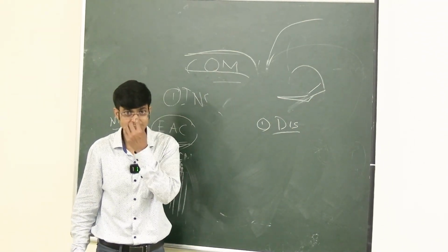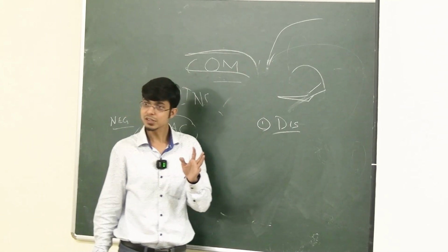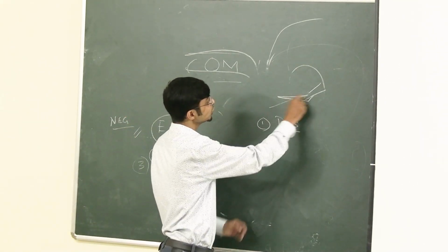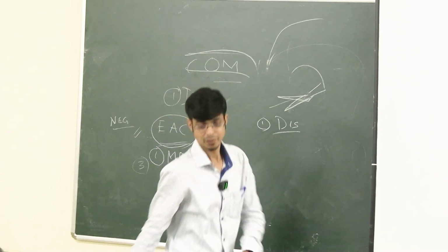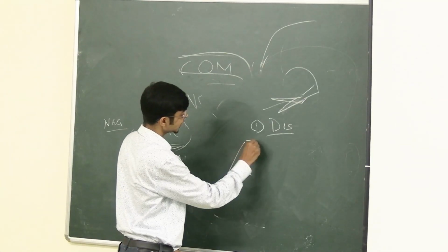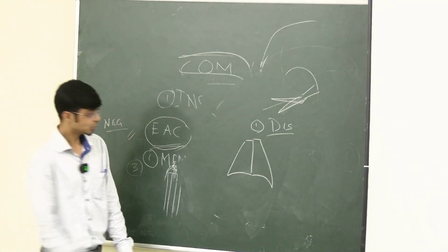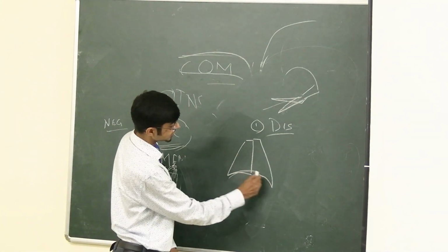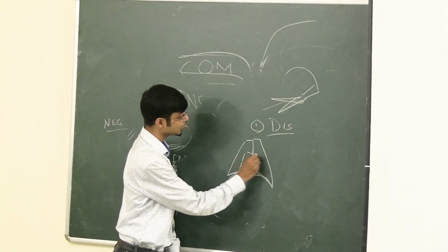So the patient will have a swelling over here, edema, pain and all those things. So what we do is, we reduce this to this. Nasal bone from the front actually looks like this, right? So this part is the one that is jutting out. The fracture is most commonly comminuted.